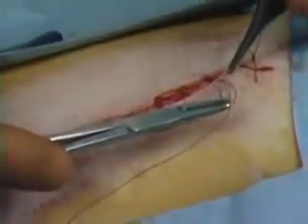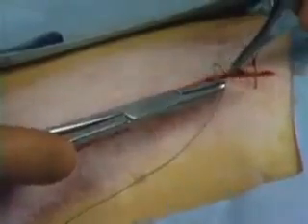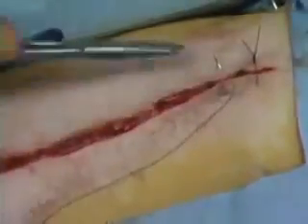This tape will cover techniques only. The student is encouraged to review in current surgery textbooks the specific suture patterns and their indications. After viewing this tape, you will be able to describe 9 listed suture patterns and classify them as to whether they are simple interrupted or continuous, and each suture pattern's tendency to oppose, evert, invert, or tension relieve.